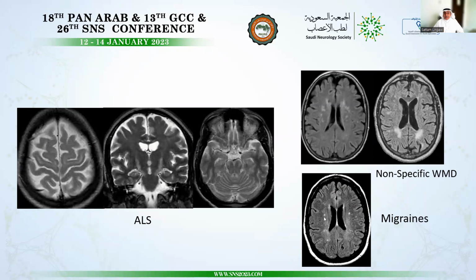Migraine gives you rather non-specific punctate high signal intensity lesions that are scattered here and there with no specific distribution. Chronic white matter ischemia can look similar, however the lesions are usually larger, confluent, and abutting the posterior horn of the body and the occipital horns of the lateral ventricles, also involving the deep white matter and the basal ganglia, with an element of generalized reduction of the brain volume, because usually this represents chronic white matter ischemia, multiple minor infarcts, hypercholesterolemia, hypertension, diabetes, etc.